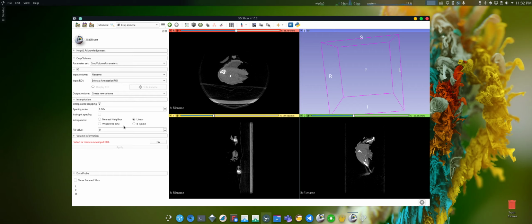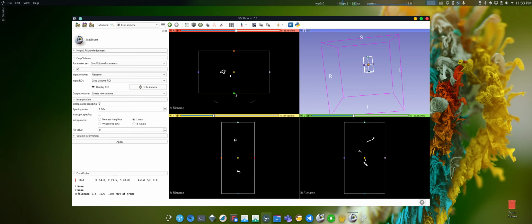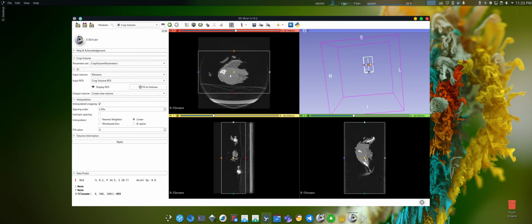So how do we start? At the very beginning, let's identify the region of interest. Let's click fit. After we click fit, the computer chooses some arbitrary region of interest. Right now, using these elements on the screen, we can reduce the size of the region of interest.